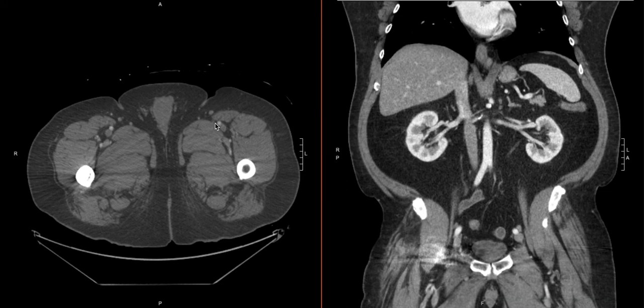And now we've traced our arteries all the way from the top to the bottom, and we've gone down basically both lower extremity arteries to the best that we can visualize them on this scan.